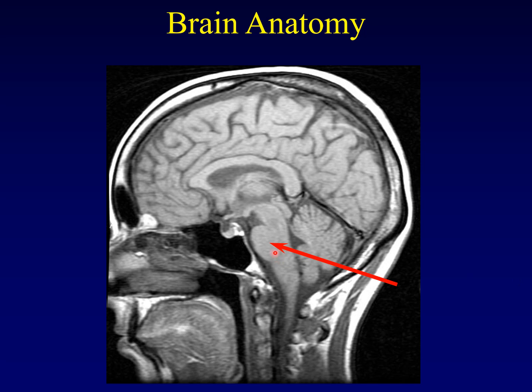How about this thing? It looks like a pregnant penguin with this bulge out the front. Well, this is all the brainstem, and the part that looks pregnant, that's the pons, right? The central part of the brainstem, or the pons, right?